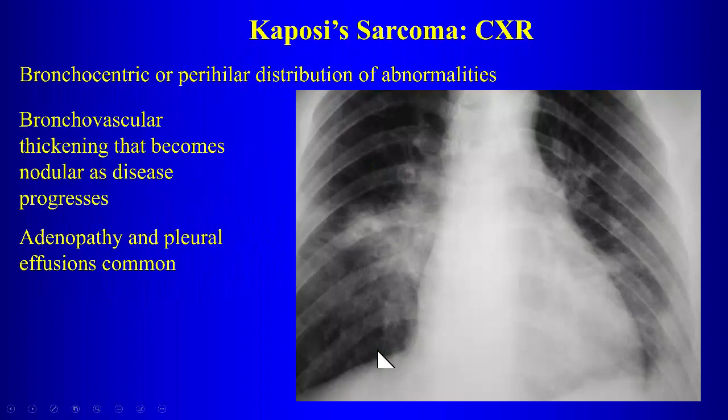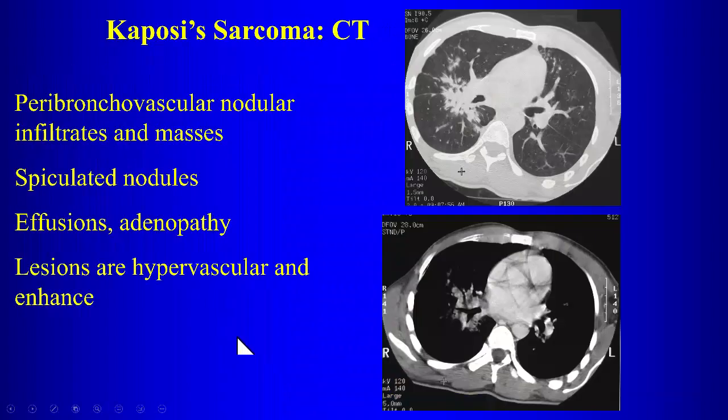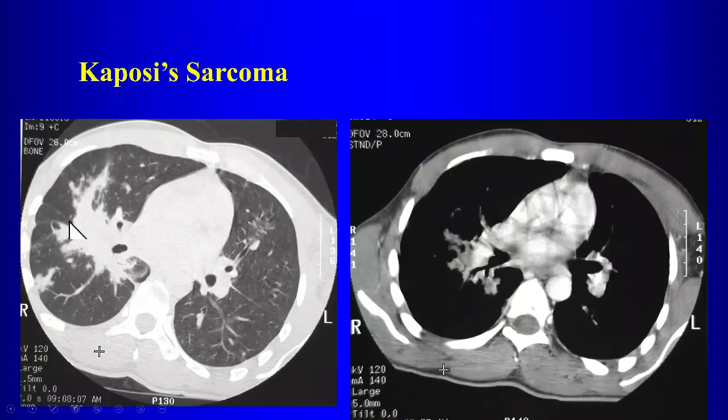So some of the manifestations on imaging tend to give you this thickening of the perihilar tissues. And so you have these perihilar opacities, peribronchial thickening, ill-defined nodular opacities that you might also see. There's a catchphrase that's used for the appearance of the lesions that you might see within the lung parenchyma, and they have those ill-defined edges. Do you know what the term is? Flame-shaped lesions, yeah. Flame-shaped lesions.